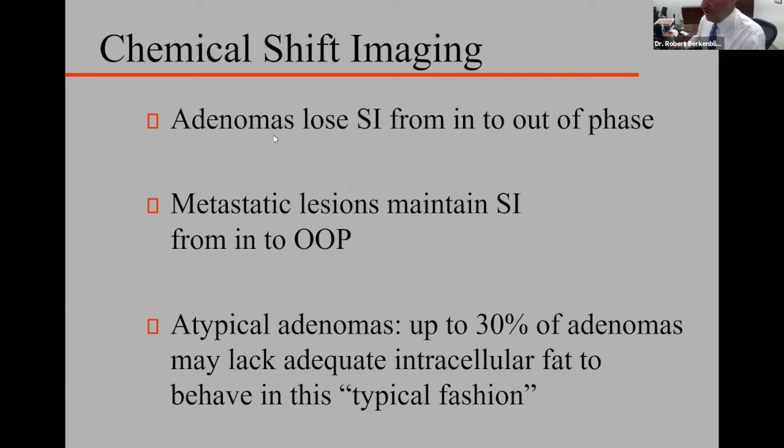So adenomas, if they're lipid rich, will lose signal from in to out of phase. Remember, fat and water in the same pixel on out of phase loses signal. Metastatic lesions tend to lack fat and therefore maintain signal from in to out of phase.